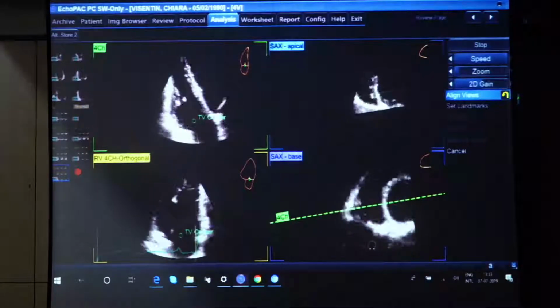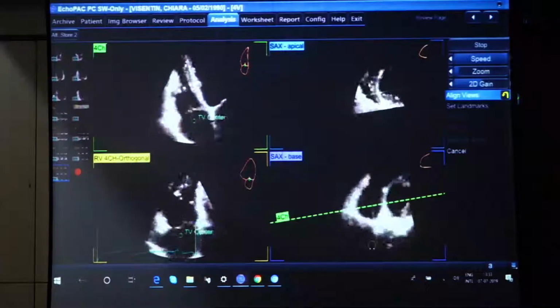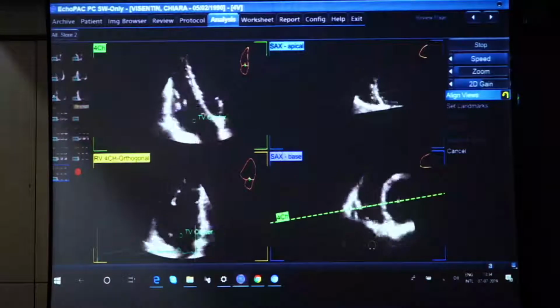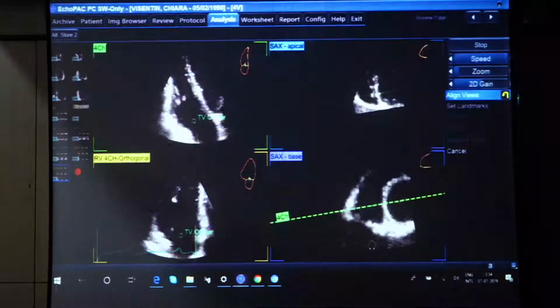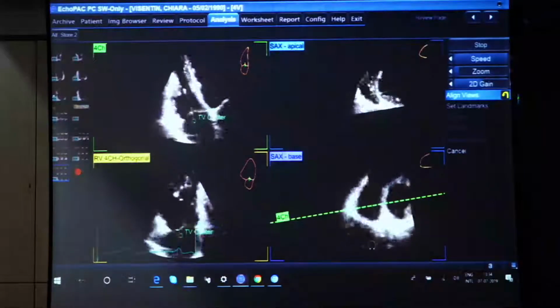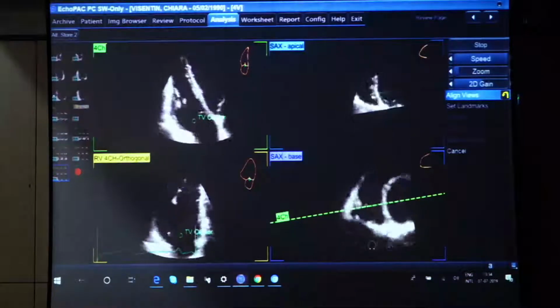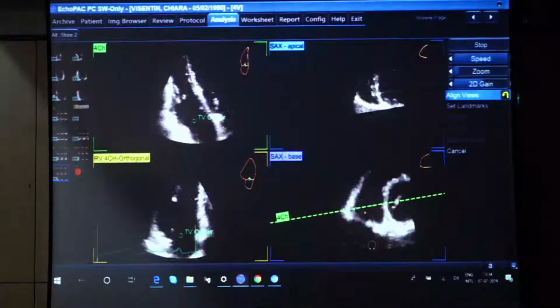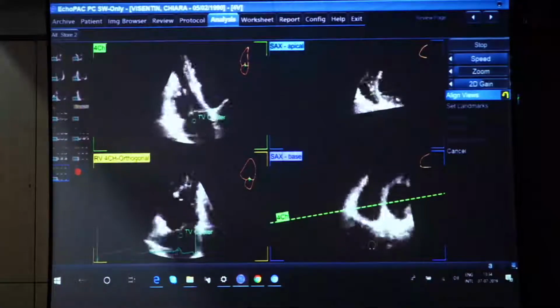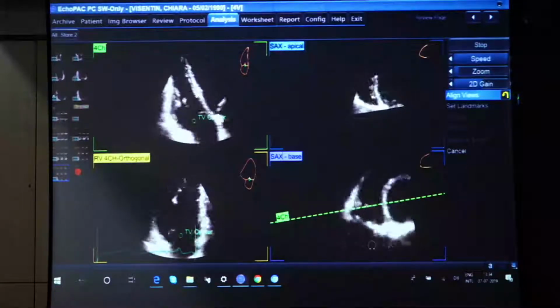Once again, if we spend a few seconds more in this orientation of the dataset, then the next steps will be much quicker. Are you here? Okay, now we are ready.